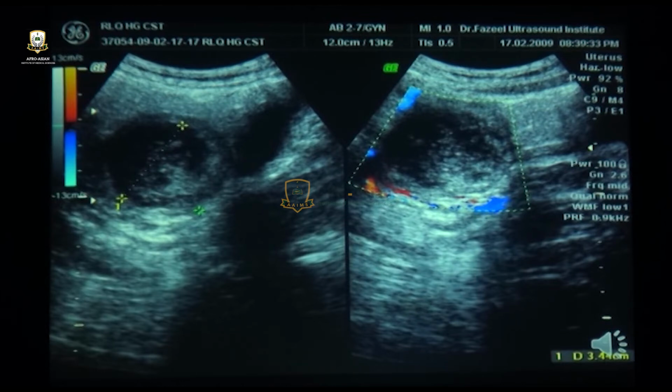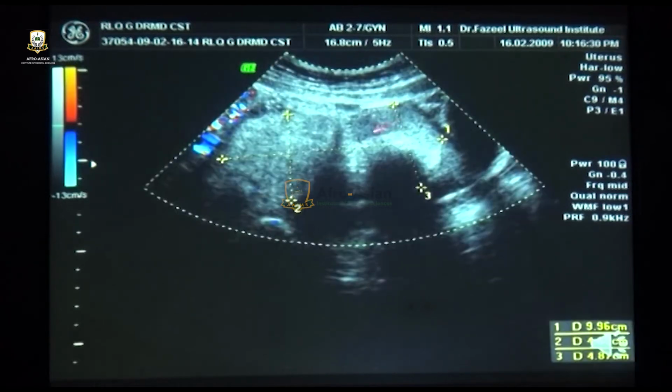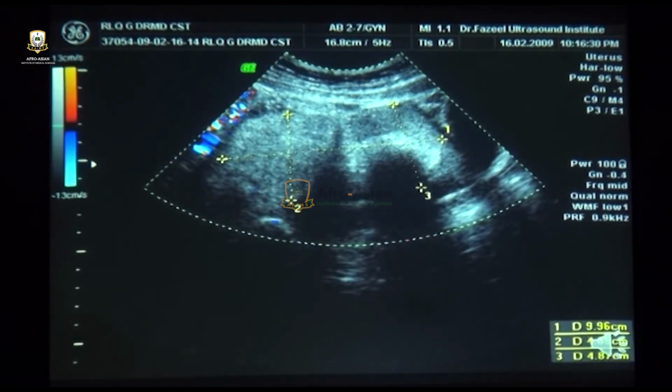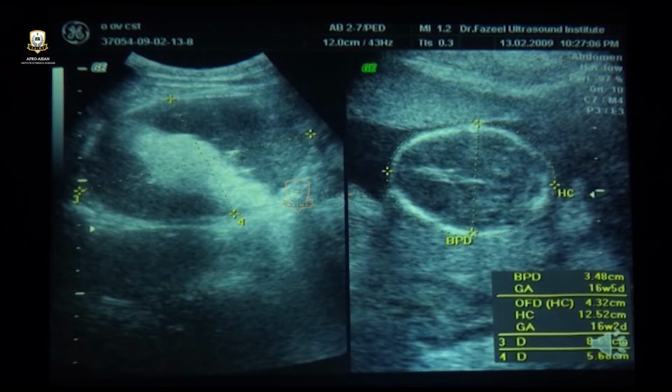This is a picture of hemorrhagic cyst, an adnexal mass with bright areas with shadowing. Okay. Can anybody tell what it is? Dermoid. Dermoid cyst having such area with shadowing. This is typical of the dermoid. There was pregnancy, and in adnexal mass you can see intensely bright areas. Another case of dermoid.